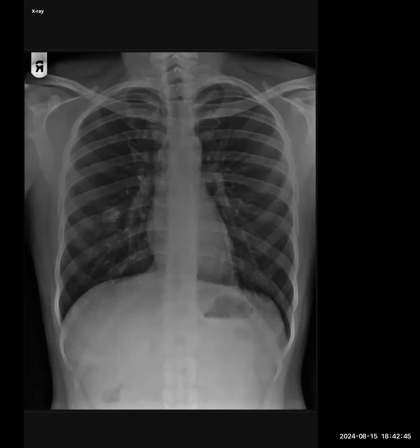Though I cannot see any fracture in the rib, it could be a healing callus in the rib, or it could be some calcified pleural plaque that is located on the anterior aspect or the posterior aspect of the chest and is projecting as a lung nodule. Okay, so if that is what you think it could be, what would be the next step? I would do a lateral chest X-ray to see what the location is, whether it is a lung lesion or a lesion located along the anterior or the posterior chest wall.